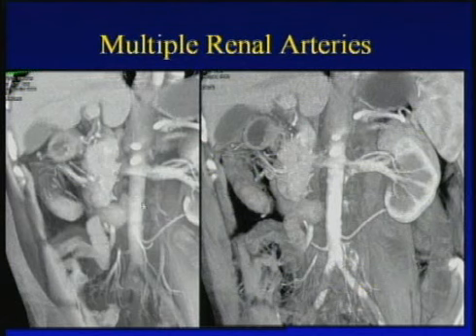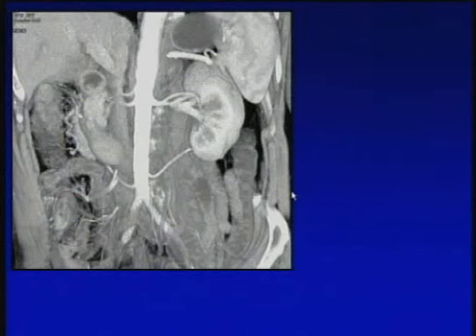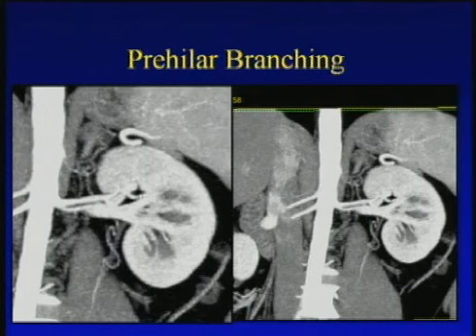Multiple renal arteries, we commented, again, axials are fine, but we also said prehilar branching, you're just not going to visualize on the axial display. So in terms of throughput, in terms of accuracy, it again makes the point that when you're looking at vasculature, you need to be within the volume. Again, in terms of technologies, creating 3D maps, that's one model people use. Our experience is you have to do the imaging yourself. The way workflow is going to go in the future is you're going to look at 3D imaging interactively, and then you'll supplement that by looking back at the axial images. But it's really the only way to be able to do that very quickly.